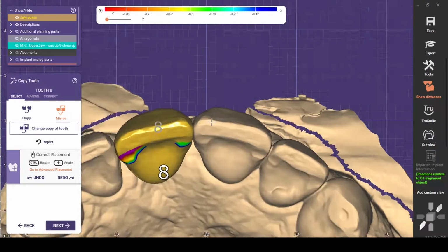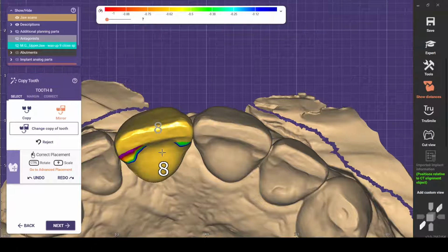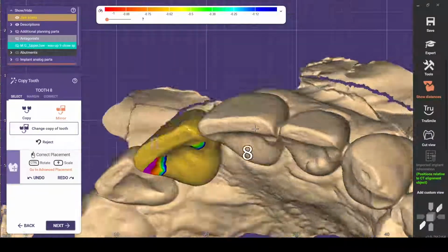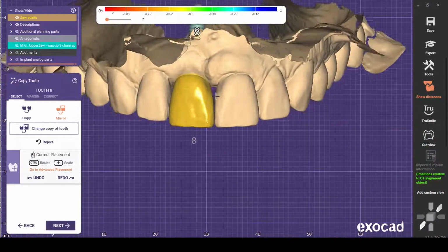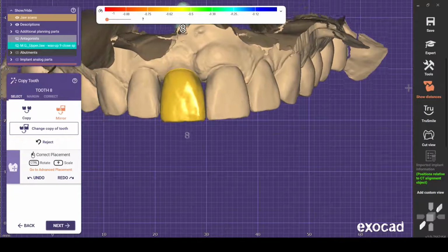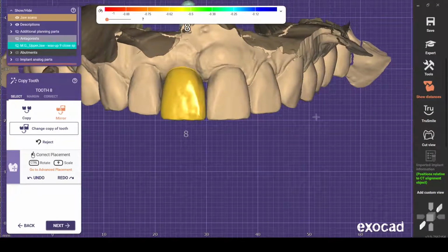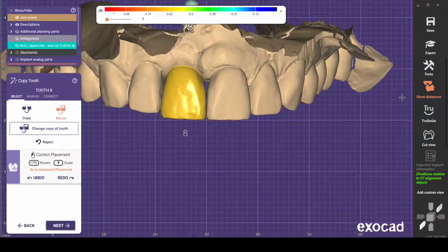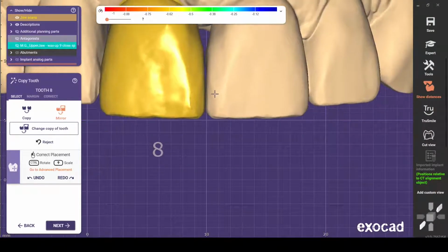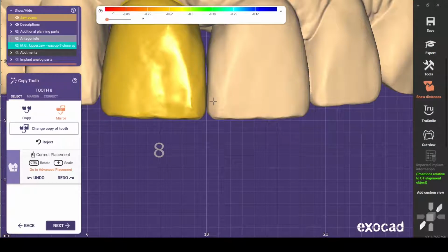So we're going to align from this view, from the straight occlusal view, bring this back, change this up a little bit. I'm not going to spend a lot of time on this. Then we'll align from the facial view. We'll get this embrasure, change the cant by clicking over here. Oop, a little bit too much there. Try to establish a nice vertical midline. Zoom in, move it. Let's make sure this is symmetric. This is touching.